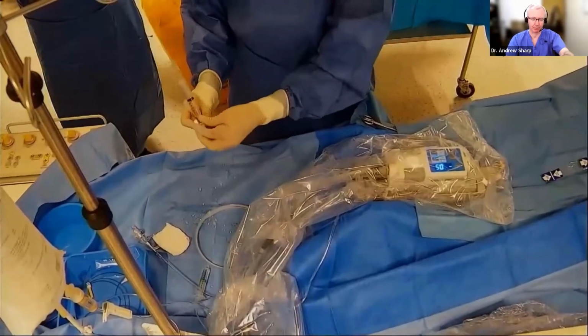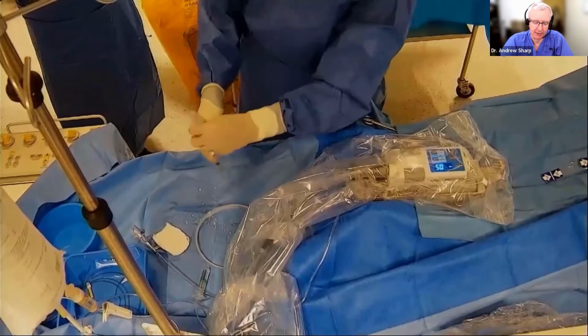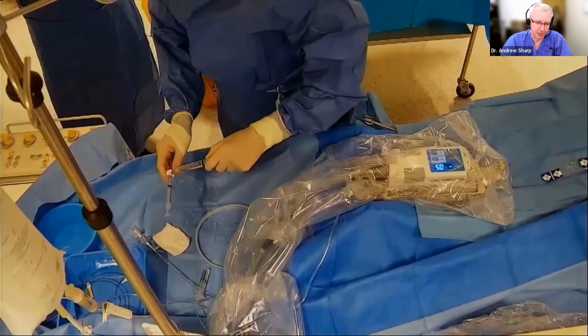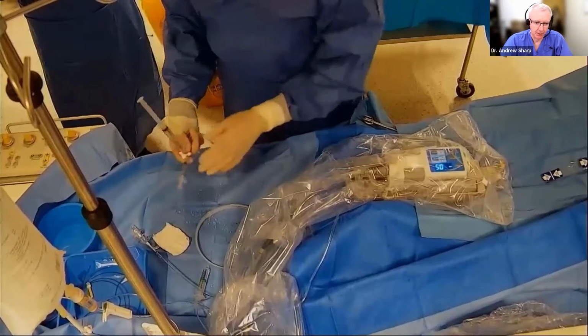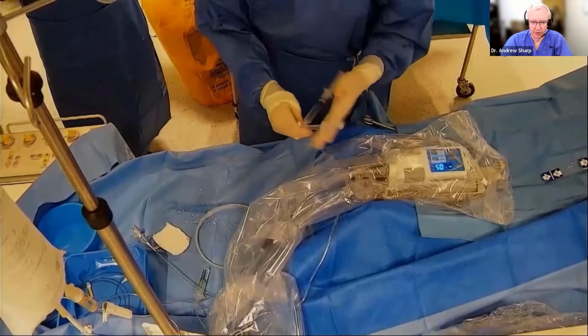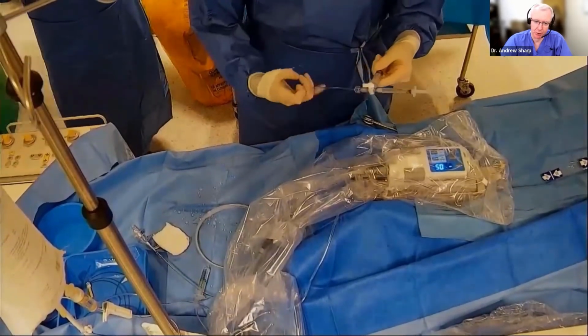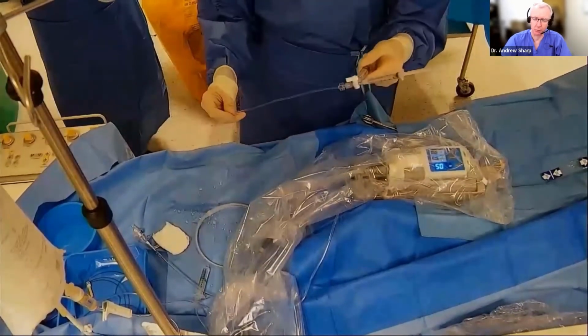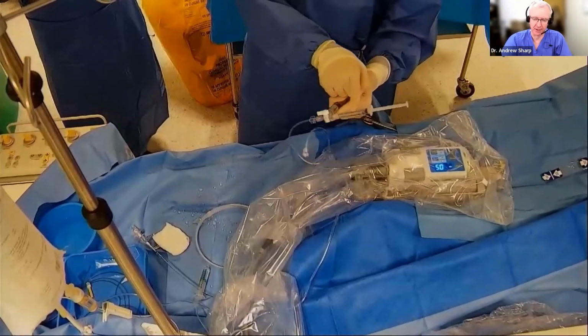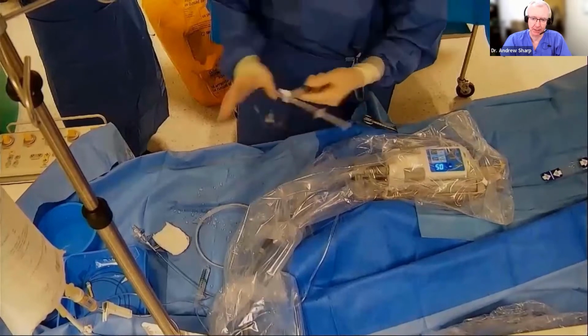So we've got this prepped accordingly, as we see here. And that is going to then refill your prep syringe if you've used it already. But what we've got is a closed system now with a 2 mil syringe having prepped all the way along that line. So all we've got is fluid now in that line. We've got rid of air. Air gets in the way of intravascular ultrasound, so we want rid of that.